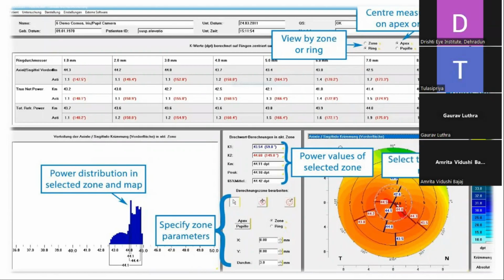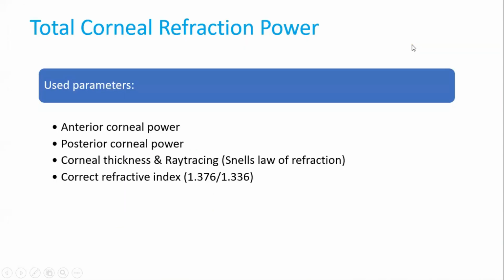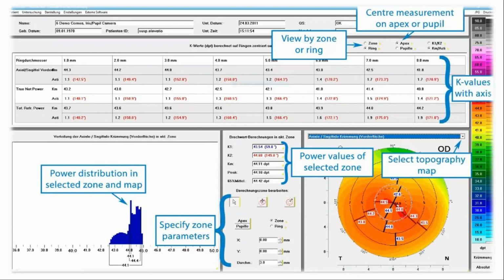So we have to change that to 4 because the ASCRS calculator accepts the value from 4, not from 3, right? And then you have to increase this to 4 and then pick up the value, because that will change the KM from here, right? So basically we have to select 4 millimeter optical zone. After looking at the top 3 parameters, then you look at the 4 millimeter zone and then take the value from there. Am I correct? Yes, sir. Correct.